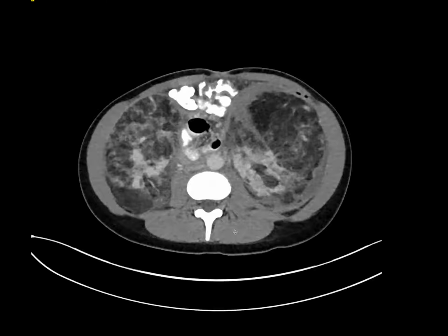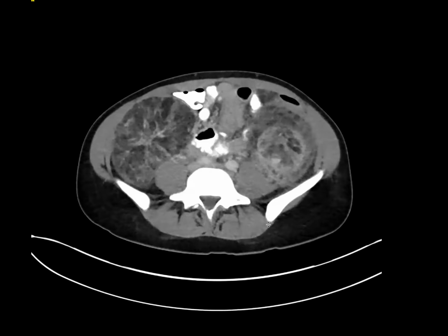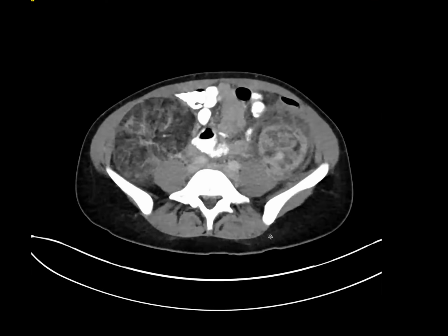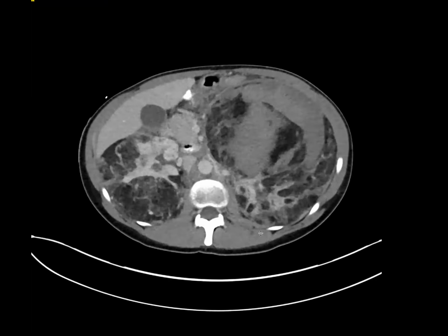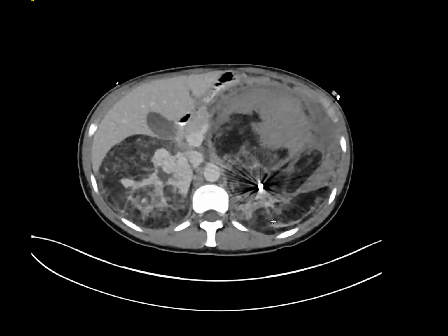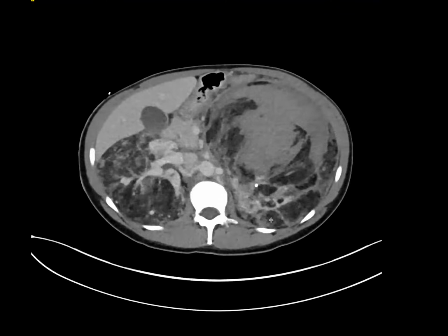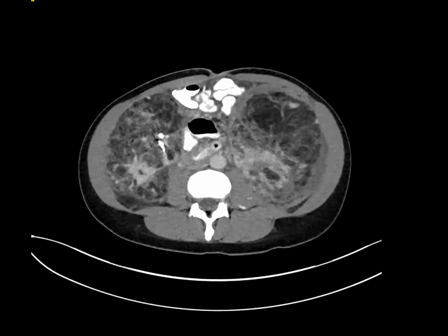Okay. So there's a patient that came in, and they were having abdominal pain. And when the ED did their labs, they found this person to be anemic. This CT was subsequently done. And I'm just scrolling through the relevant areas. There are two findings that you guys have seen, but there's a finding on this image that explains what's going on. And I'm sure you guys are all aware what this entity is.